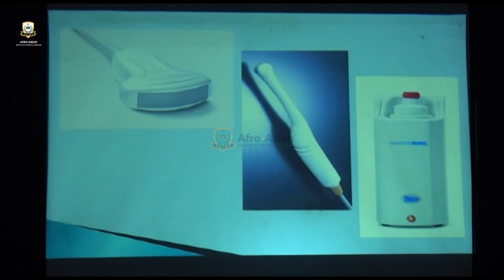You all know these are the 2 probes. And an interesting thing is that although the picture of this is quite odd in today's heat, in winters you need to warm up the gel. I don't know how you warm it up, but there are tools available. This one is readymade. Another option is a baby feeder warmer. That can also be used.